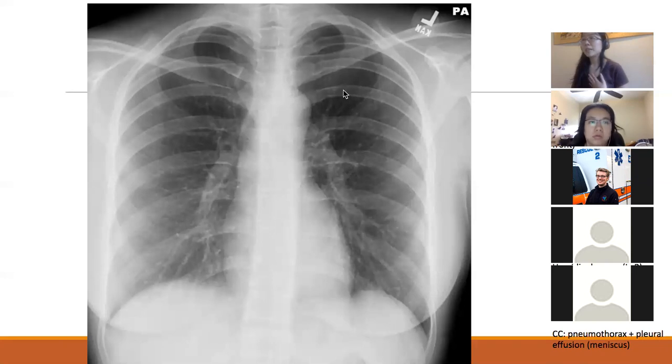And for me, that's often bones. So we can tell that there are some ribs here, right? There's some ribs that tend to look a little bit straighter. And then if you look even more carefully, there's going to be some ribs that sort of wrap around and are kind of curved, right? So it's pretty clear that we're seeing 2 different views of the ribs in the rib cage, right? Because as I stated earlier, this is a 2D representation of a 3D image.